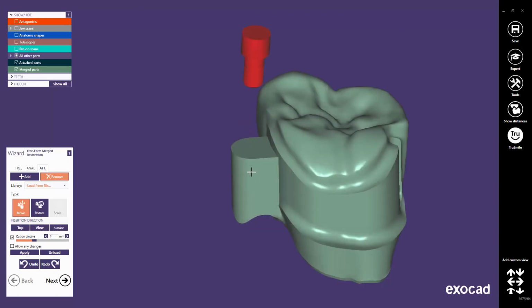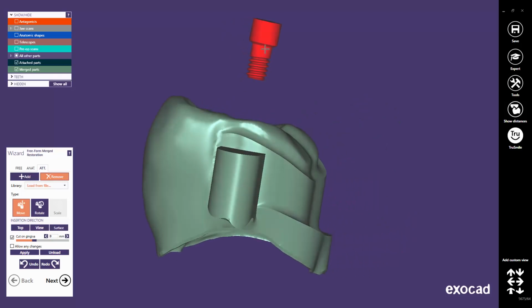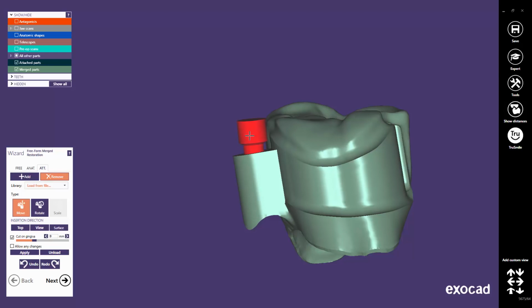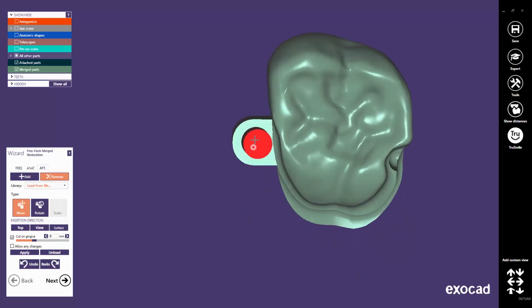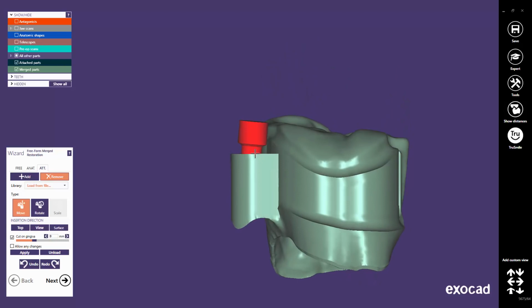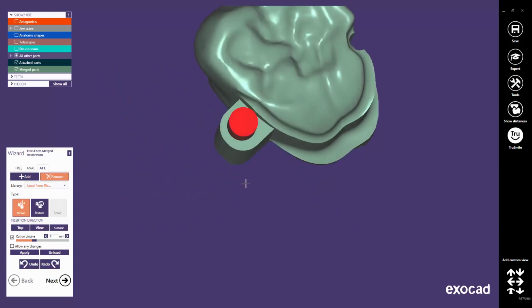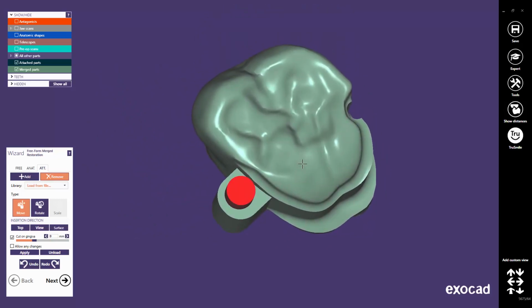Certainly, imported parts can also be added or removed. I have chosen a screw to remove as I want to create a thread. If your own part is orientated parallel to the Z-axis, you may set its direction parallel to the telescope direction by using the top button. Click on Apply to create the thread.